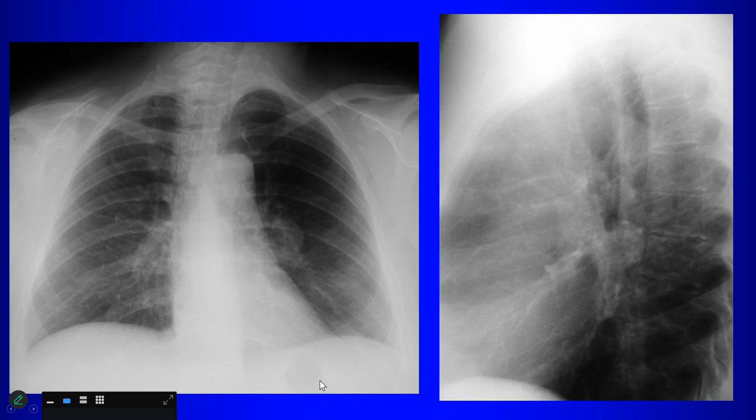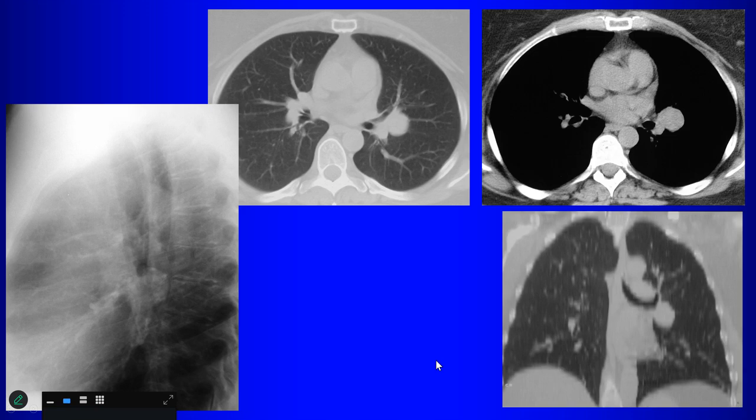How about this one? Again, like subcarinal lymphadenopathy with, looking at the left hilum, maybe some left hilar lymphadenopathy. Yeah, so there's this abnormal opacity here over the left hilum. There's a nice donut sign over there, so there's something wrong here, right? So this patient needs to go to CT. It turns out they have a tumor in the lung that's actually projecting over and giving you that donut sign. But still, the donut sign is abnormal, okay? And so this patient needs to go to CT.